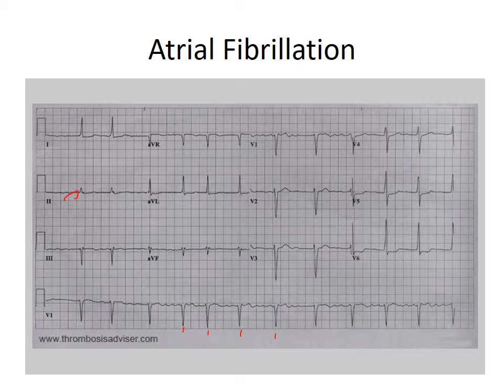All right, precordial leads, V1, 2, 3, 4, 5, and 6. Do you have any flipped T waves? No. Do you have any ST elevation? No. Do you have ST depression? If you look really close, V4, 5, and 6, you do have a little bit of ST depression. It's not very significant. It may be like one little box, if that. So I wouldn't call it significant. But just a note, yeah, it's a little off base, but all right. So atrial fibrillation, left axis deviation, no ischemia, no infarct, no flipped T waves or inverted T waves.